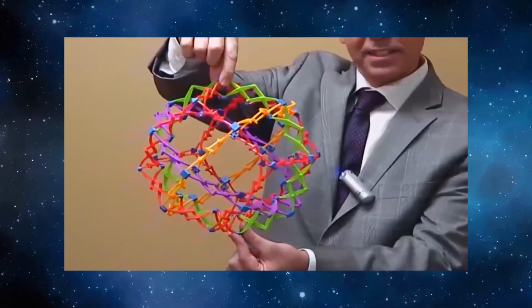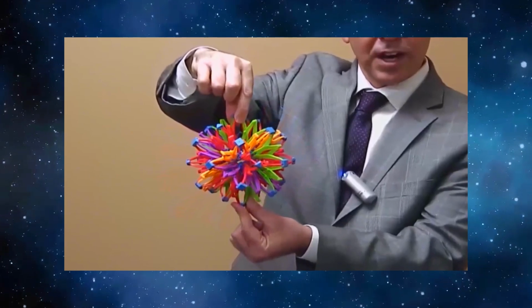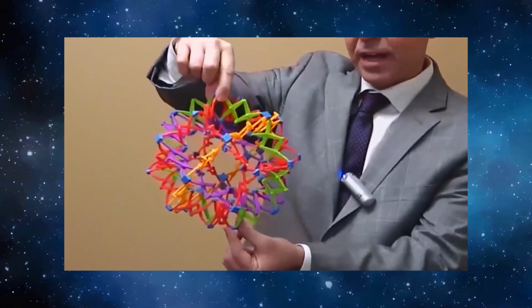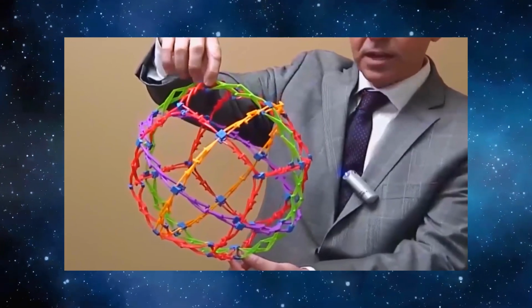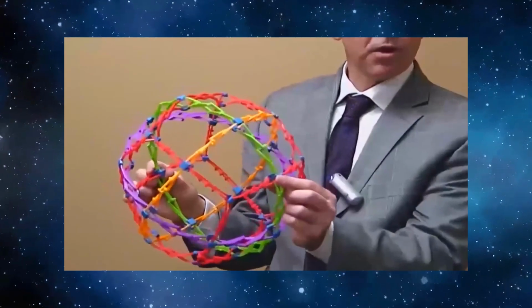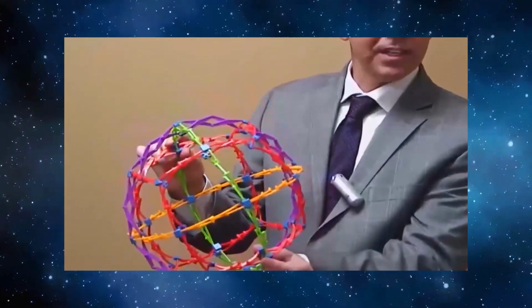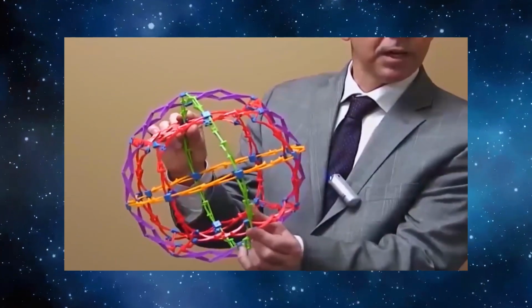Basically, we're going to say as it contracts down, it's experiencing negative longitudinal strain. And as it contracts back out, it's experiencing positive longitudinal strain. Now, the other thing we want to look at is the thickness of the wall of the Hoberman sphere, and that's represented here by the distance between my forefinger and my thumb.